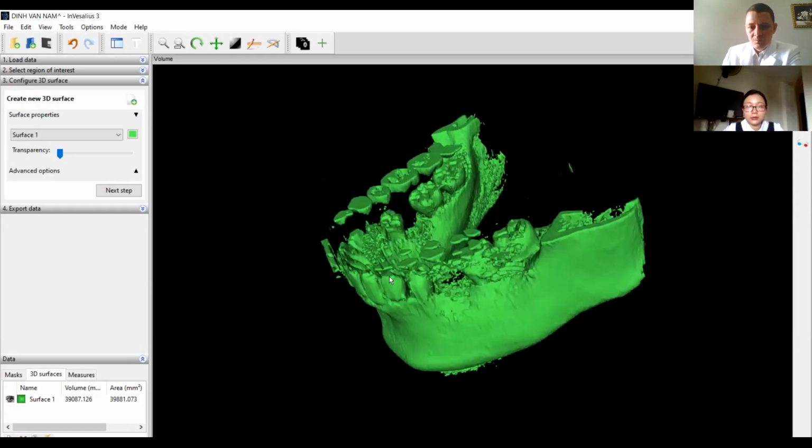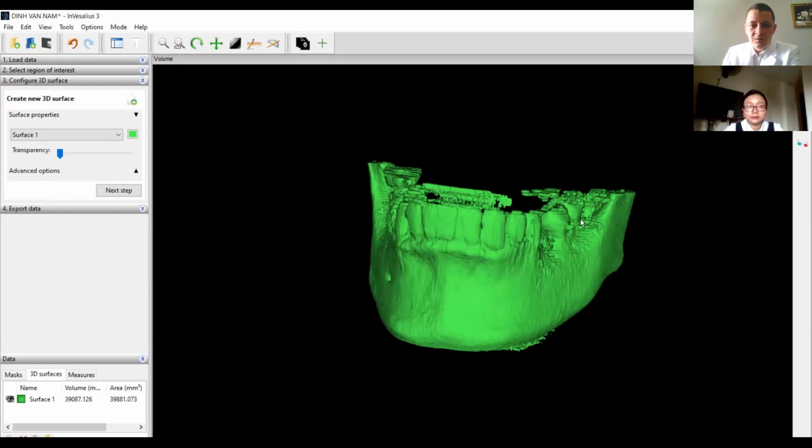So now you want to clean this. So next step.